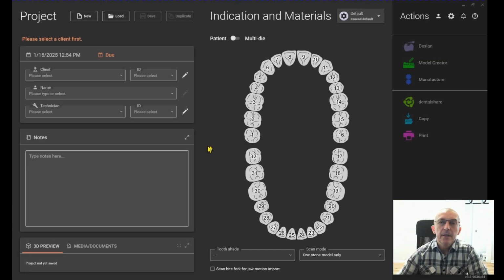Hi everyone. I'm sure you guys already went over how to scan models into 3Shape, how to make order forms, things like that. So once you figured out how to export the STLs, we can actually import them into Exocad. So let's go through some of these steps in Exocad, how to make order forms, etc.